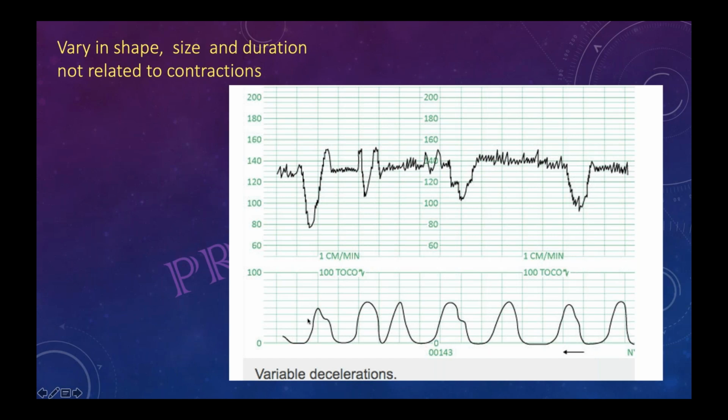Yeah, it is coinciding, and the rest is not related to contractions. No, but the first one, from the onset of deceleration to the trough, is less than 30 seconds. If we consider that property, it will not be early. Yes, okay, you are right.